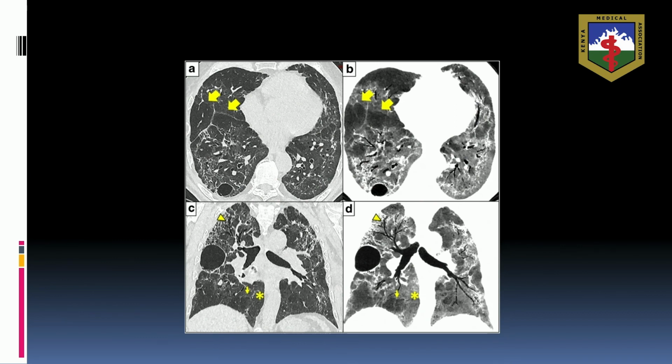longer term disability. In BNC, you can see those are expiratory views, and you can tell that there is reduced attenuation because of air trapping. All right. Now, again, you look at things like loss of lung attenuation, loss of lung architecture. In that one, you can actually see pneumatocysts developing there, and this is somebody who had long COVID, who had a previous history of COVID.